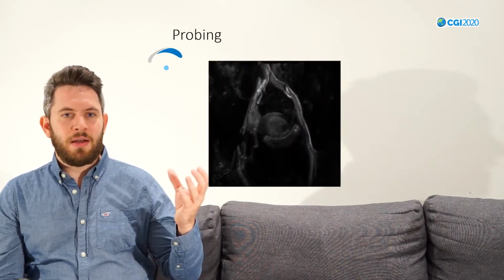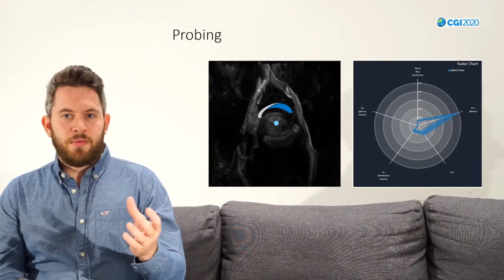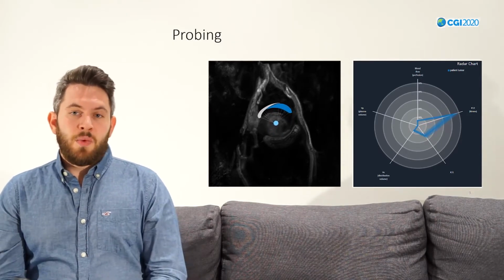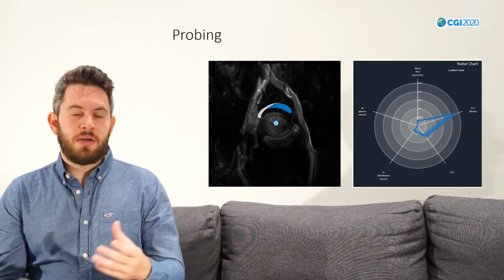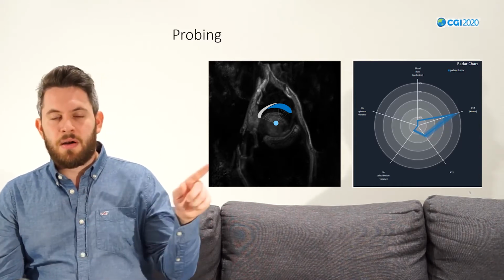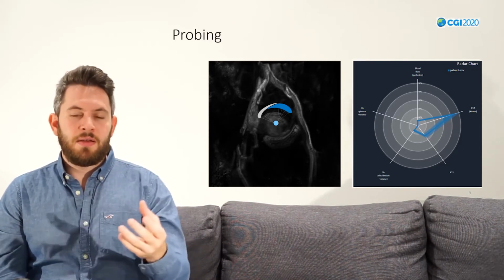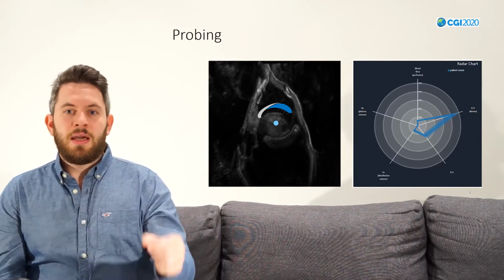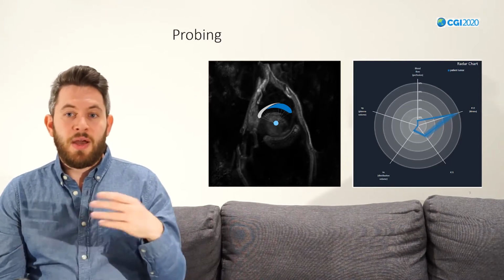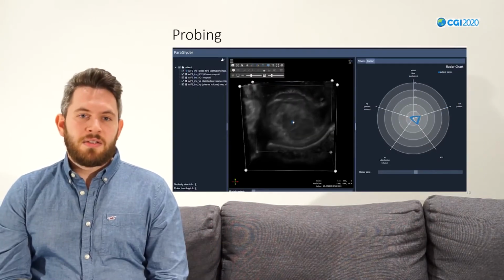Now we really have this ParaGlyder, and this ParaGlyder now goes into the volume, and when it glides around in the volume, you can see the radar chart updating automatically. So what are we showing here in this radar chart? The radar chart consists of 5 or even more modalities, and the axes are lined up in a star pattern. What we're doing here is we take every voxel within this sphere, we calculate the mean and the quantiles, and the mean is a dot on this axis and the quantiles are the band that you can see, for example, in K12. And what you end up with is something like a radial box plot showing us the data within the sphere. And this is how it looks in the application.